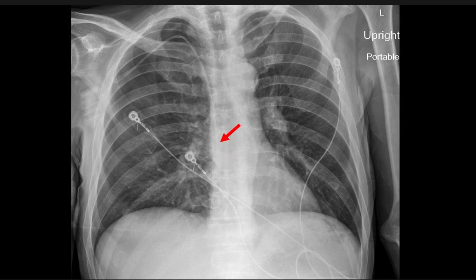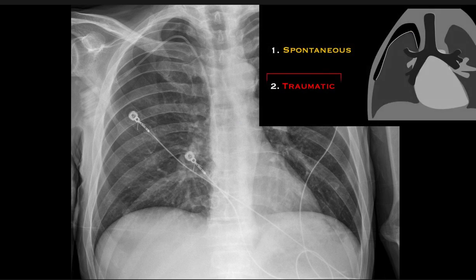But we remember from earlier in the talk, when we were discussing the different categories and causes of a pneumothorax, I talked about trauma being one of the big categories, and not just being stabbed or shot or some kind of closed trauma, but also iatrogenic stuff, particularly line placement. So we know that that's a possibility, so we're going to ramp up our sensitivity. These findings can be tough. Pneumothorax can be tough to see.